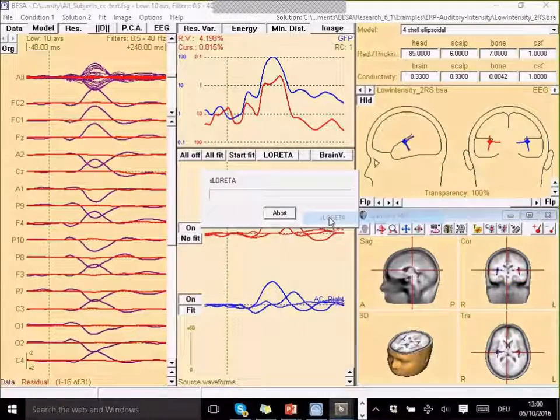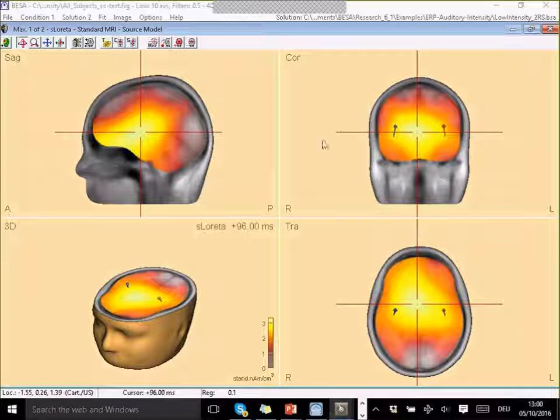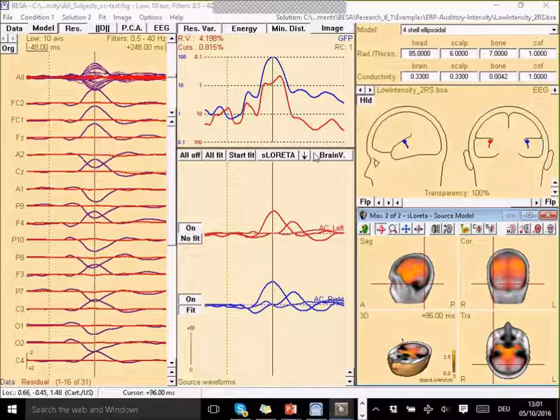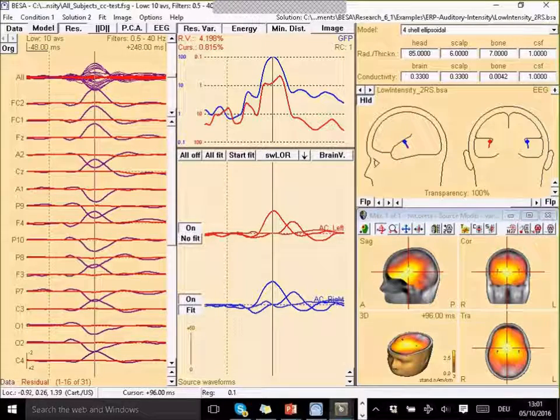So S-LORETA is a similar result. It's got 2 maxima, 1 in the center, 1 very far out and very little intensity. So also really just 1 large maximum. SW-LORETA is the S-LORETA with depth weighting, has a similar result again. So let's move to the iterative methods.